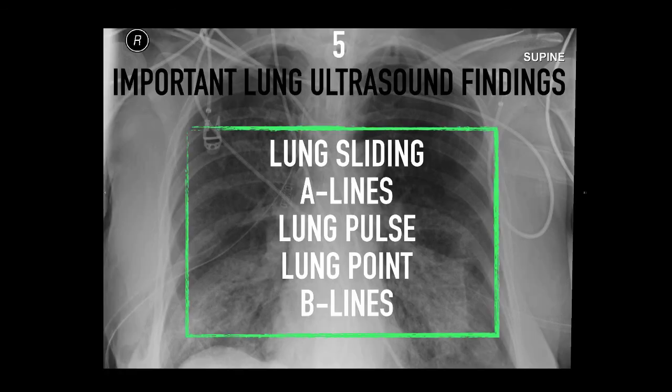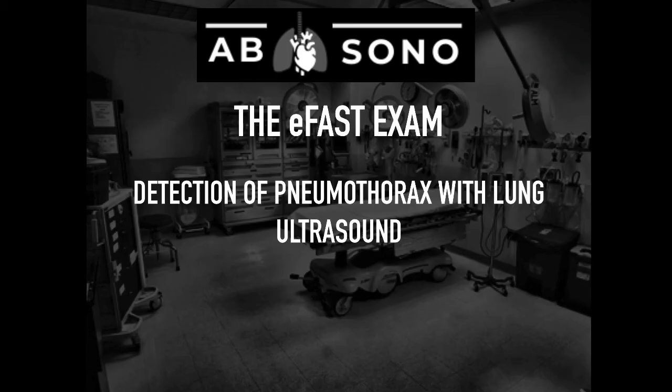There you go. There's 5 important lung ultrasound findings, from lung sliding to A lines to lung pulse to lung point to B lines. Thank you for listening.